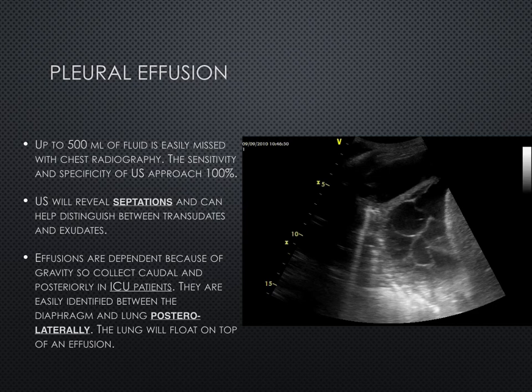Always remember that effusions are most readily found within your dependent lung region. So, looking at your inferior aspects at the diaphragm and at the posterior aspects, especially with our patients who are lying supine. And I've given you some indication as well about how you can look to measure those using different calculation methods, or whether you're going to eyeball that volume as well.